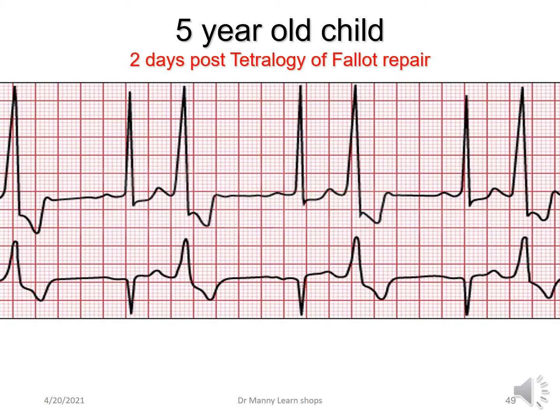What you can see is an irregular rhythm, but you've got premature ventricular complexes, and these are referred to as bigeminy or bigeminal, which we didn't discuss. Bi just means two, gemini means origin, and here, ventricular, from the ventricle, so they're together. Here they're together, they're not couplets, because you've got normal, abnormal, normal, abnormal. This is ventricular bigeminy, and you can just say bigeminal PVCs.